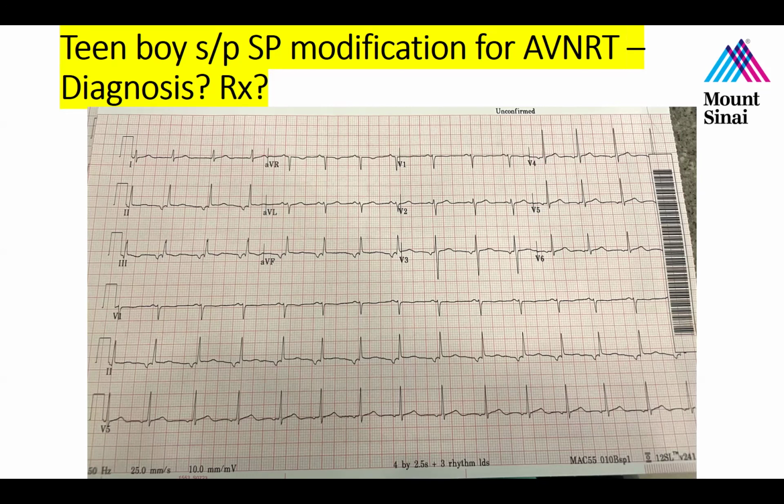So I agree, we are not in sinus rhythm. We are in some kind of an ectopic atrial rhythm. But since you've brought this question up, why do you think it is that I agree with you? The PR is a little on the short-ish side. It's actually probably on the lower range of normal, but it is short-ish. Why do you think that is based on this P wave morphology and axis? I think maybe where the P wave is originating from is closer to the AV node.